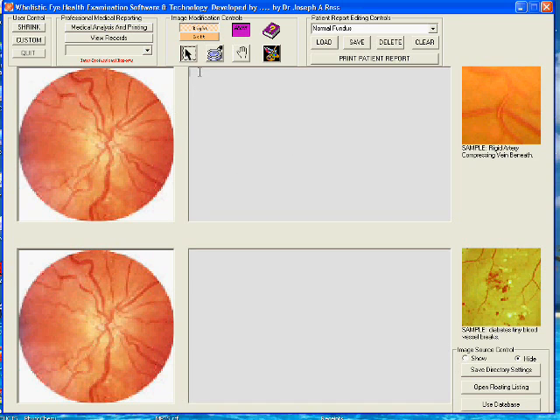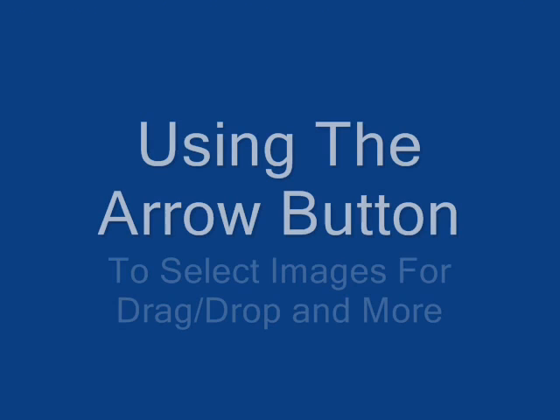If you select the left button here, well, then you will see that the left eye is selected. I will show you how that works in just a moment. So at least you know that these boxes select the corresponding graphical displays of the retina on the left.